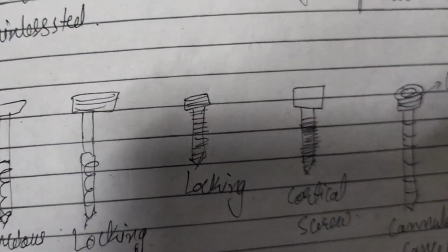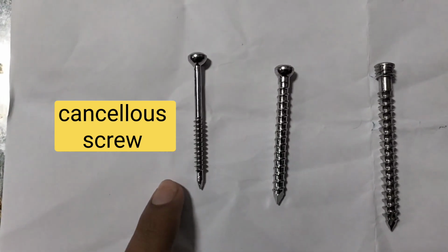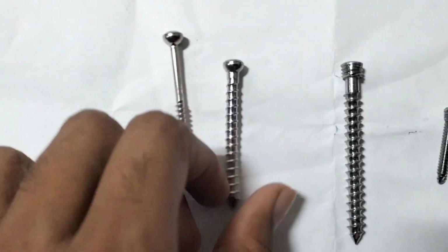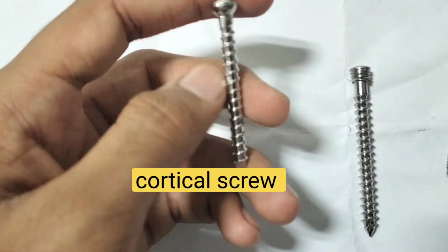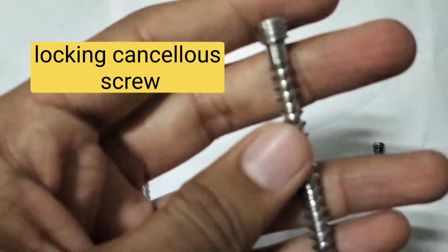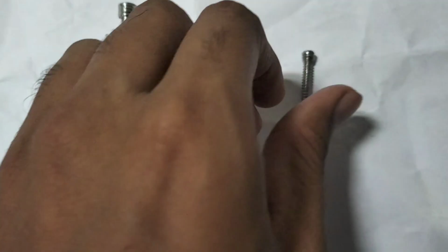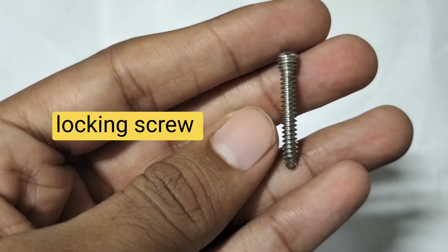Now I will show you the screws. The first one is a cancellous screw. Next, this is a cortical screw. A cortical screw has threads throughout, from top to bottom. Next, if the head also has threads, and both the head and the whole shaft are threaded, then it is a locking cancellous screw. And the last one, if it is a small screw with threads throughout, then it is a locking screw. It helps in locking.